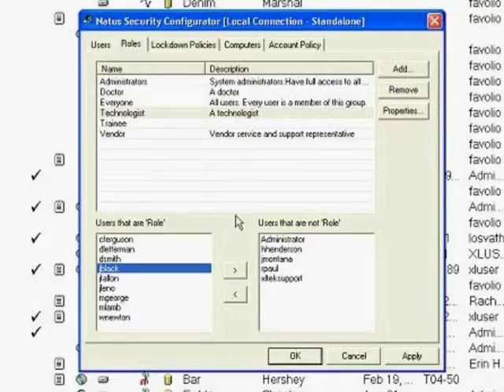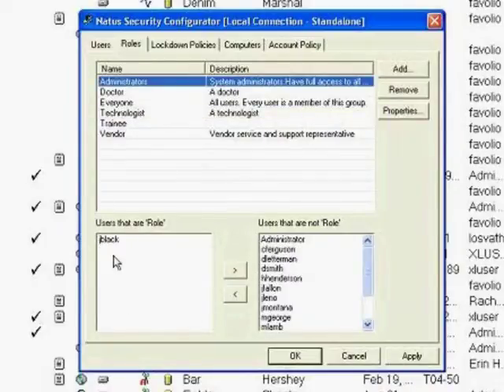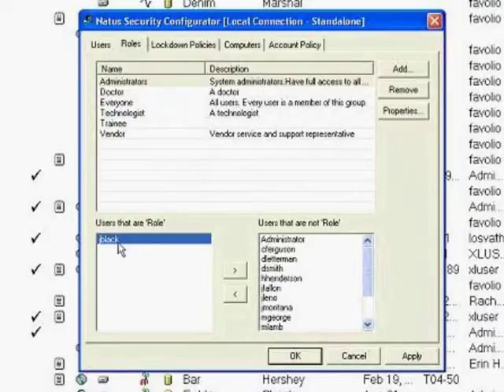And where's Joe Block? I'm going to move Joe Block. Let's say Joe Block is my administrator. I already set this up, so I made Joe Block the administrator of the lab. He's the one person that has access to everything. And Joe Block, if you recall from the roles, is the only one that has the ability to archive, delete, and purge a study. So again, for traceability and accountability, it makes it a lot easier for me to trace back what happened to a study if there are any issues.